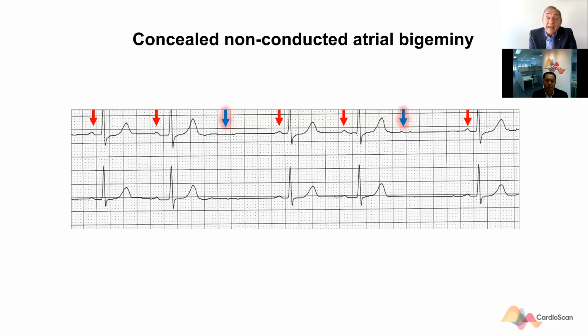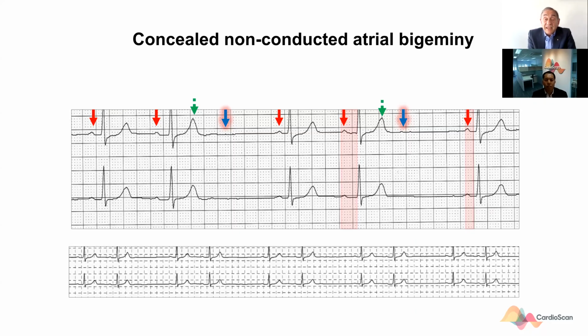Is this asystole? No. What we can see, therefore, is the longest, shortest, and then sitting at the peak of the T wave is a concealed, non-conducted atrial ectopic. And this creates atrial bigeminy. The most confusing, but if you look at it carefully, a very obvious Wenckebach AV sequence. And have a look at the tracing showing that this type of bigeminy lasted a considerable amount of time.